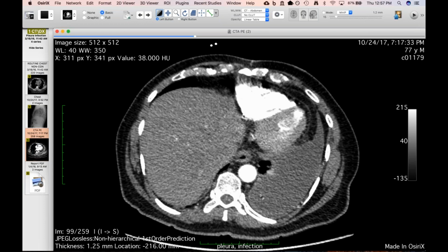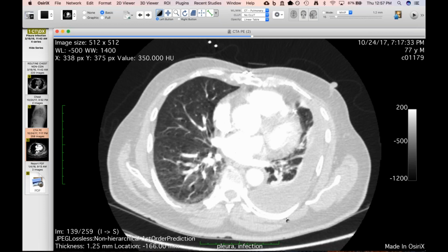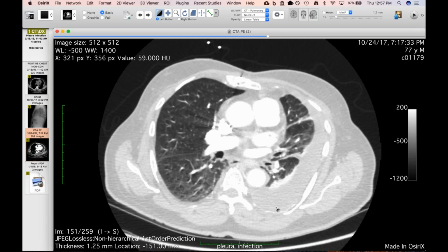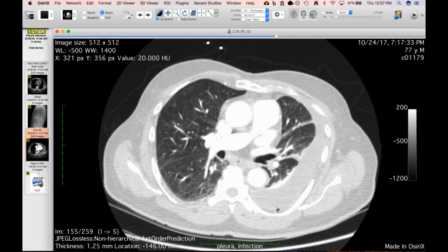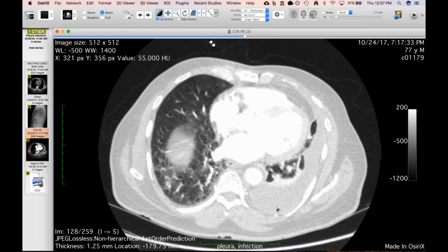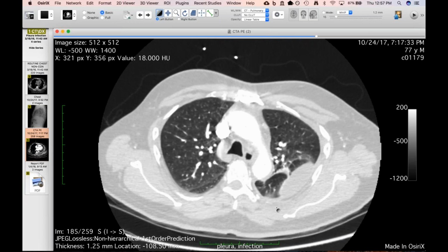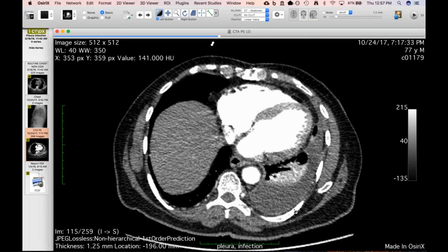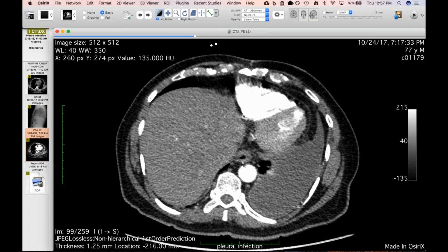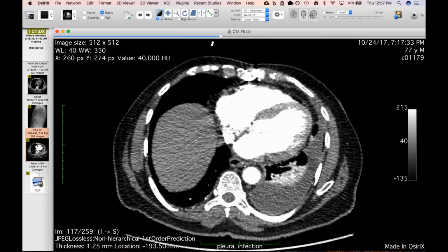He had no history of cancer, and you can see he just has a little bit of atelectasis in the lung and nothing else really. He had several months of cough, weight loss, not feeling great, and B symptoms, which I didn't know at the time. We just said the differential was probably some sort of infectious pleural effusion, maybe malignant, especially if he had a history of cancer. And he was lost to follow-up to me until I saw a radiograph last week when I was working over the holidays.